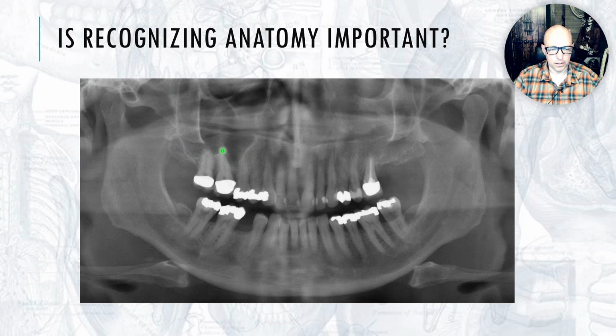Fine to have big sinus loculations like this. The sinus continues to grow as we age, continues to pneumatize. Here this part of the sinus looks a little thickened. That's not the sinus, but this bone may just be anatomical variation. This is the pterygoid process. This was the posterior border of the sinus. That looks fine. And then it kind of really thins out here. And where is the sinus? We still have my favorite structure, zygomatic process, orbits.